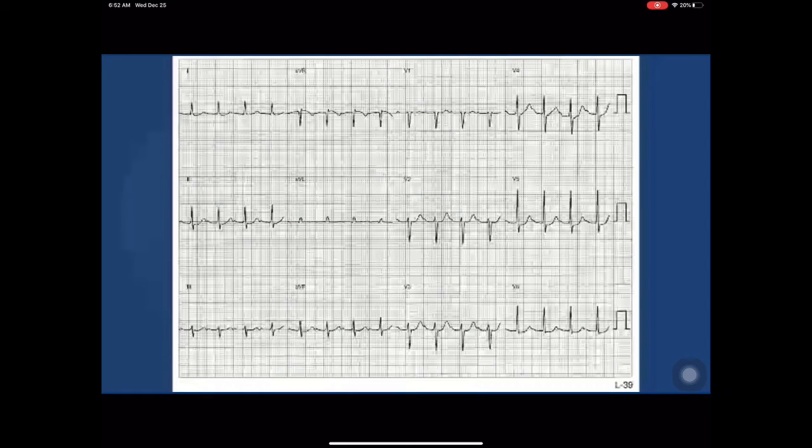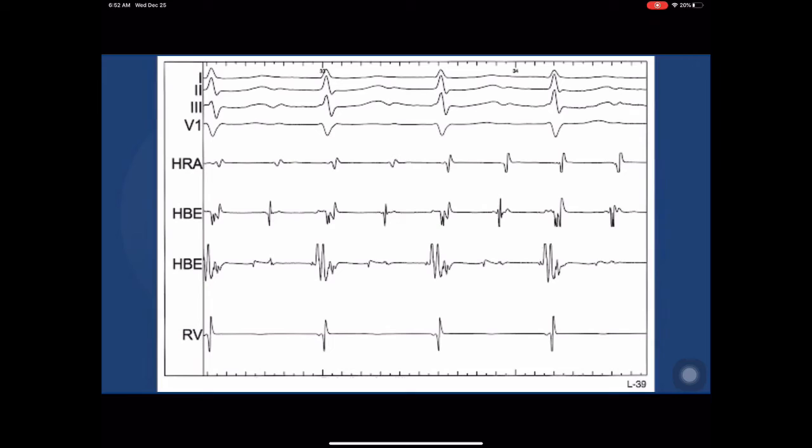And a narrow P wave means that you have to be coming from an area of the heart where there's cancellation of forces, of atrial forces. And that area is almost always in the anterior atrial septum, because that's the true septum of the atrium. As you go more posteriorly, you're really measuring an atrium, right atrium, as you know. It's not really a septum. And when you go anterior, the right and left come together. And so what you get then in people like this is 2-to-1 block below the His with classic slow-fast AV node reentry. So look at the intracardiacs here.